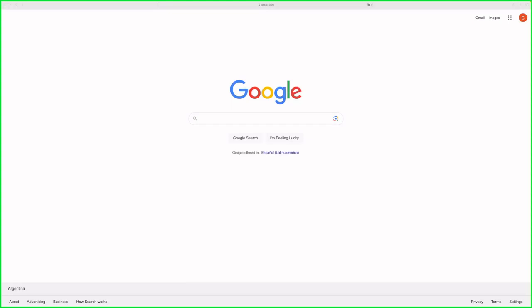Hey guys. So we are here to explain how to use our EMS assistant for providers. And the very first thing that we need to do is to log into the system. We made it very simple. All you have to do is visit our site, which is chat.fastmedical.ai, and that's pretty much it.